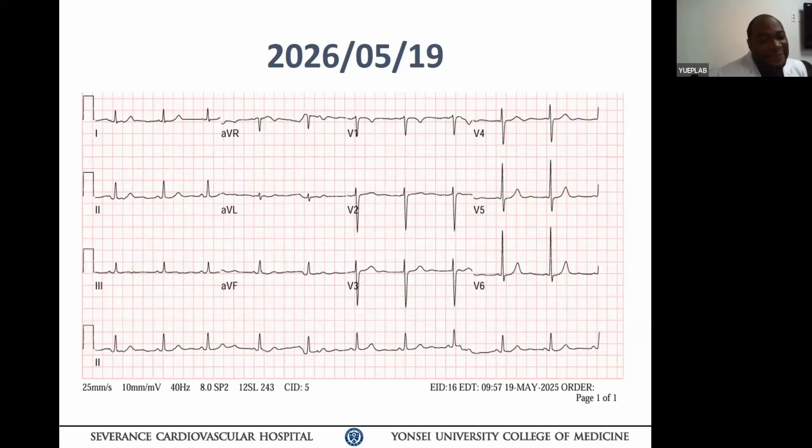This is another ECG, same patient, 2026. So the same pattern we saw in 2022, 2024, 2026. If you look at the P wave axis, in aVL the P wave is flat or almost negative. And lead 1, very small, tiny positive. In V1, the precordial transition of the P wave is abnormal, if you're arguing that. D3 until aVF is flat. That's not normal, right? And all the precordial P waves are very flat.